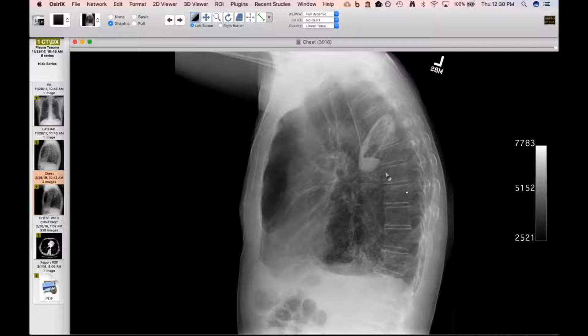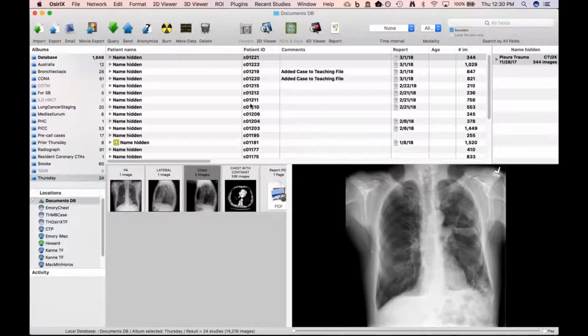Yeah, I think we're all on the same page. There's trauma that happened at some point in time. Yeah, I like the contre-coup idea. That would tie it all together nicely. I think it's layers of trauma. Former left trauma, and now trauma.